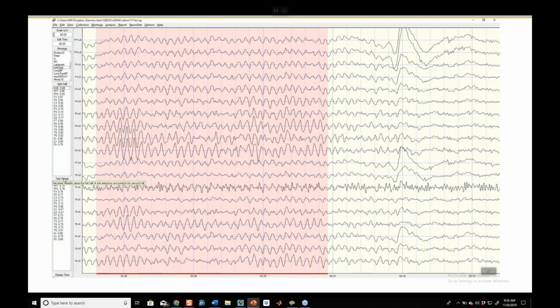Right. So the point in this is, if you find that your numbers in terms of the validity and replicability of your data are poor, chances are you have two separate states. And in this case, we just had someone that entered an alpha state for a moment, but I would not accept that alpha data if the rest of the EEG was pretty consistent.